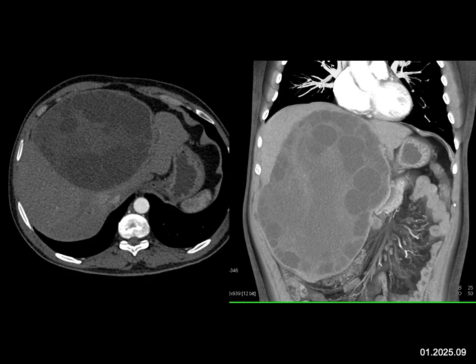Now, amoebic abscesses are possibilities, but they're typically cystic, no septations, typically in the right lobe of the liver, right lobe posterior, and usually smaller in the 3 to 5 centimeter range. Biliary cystadenomas, they're now called mucinous cystic liver masses, can be large or cystic. We look for solid components because we worry about that cystadenocarcinoma. But here there are so many daughter cysts present, that's not the appearance of the classic biliary cystadenoma or even cystadenocarcinoma, so I don't like that possibility.